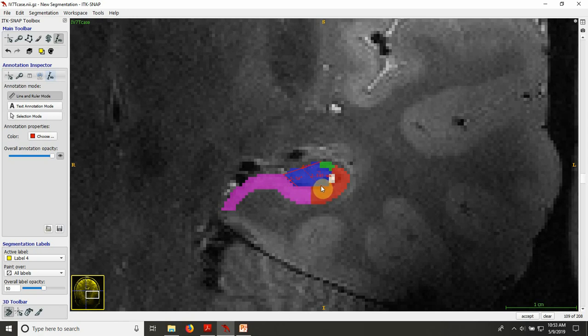And I have a bit of difficulty finding the right angle. It's a bit of an approximation here. So an important part of this third line is that it starts at this edge of the dentate gyrus and then ends at this edge of the dentate gyrus. And then the fourth line goes from the midpoint of the third line and then at a 90-degree angle. So more or less like this, and everything in this region is then CA3. So I'm going to give that the yellow label.